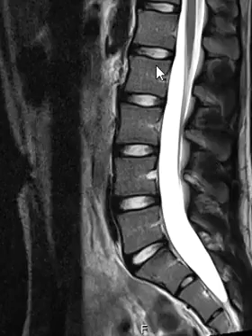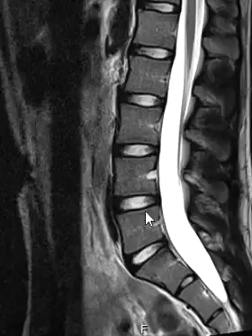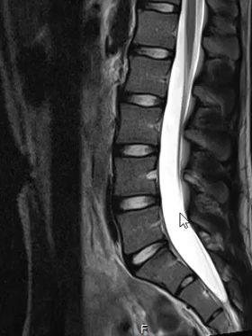So this is a side view of the lumbar spine. We can see each one of these vertebral bodies all nicely spaced right on top of each other. There's no slippage. And these things in between that are bright are the discs. And each one of these discs looks absolutely normal. The spinal canal is back here. It's filled with fluid, which is really white.